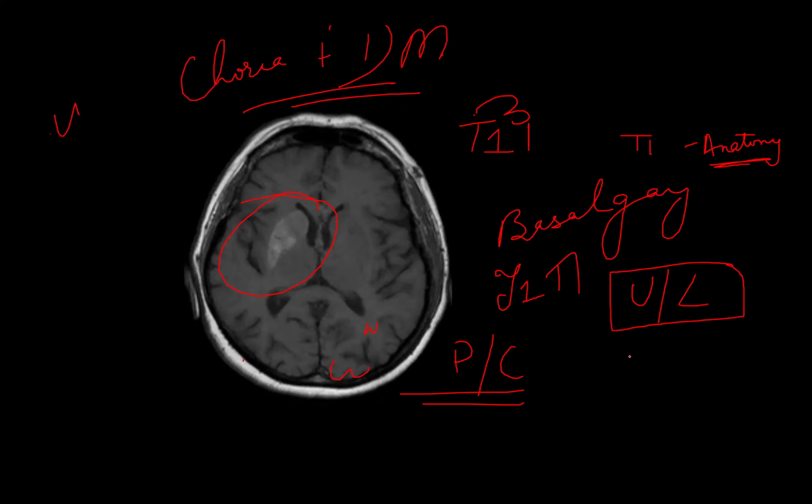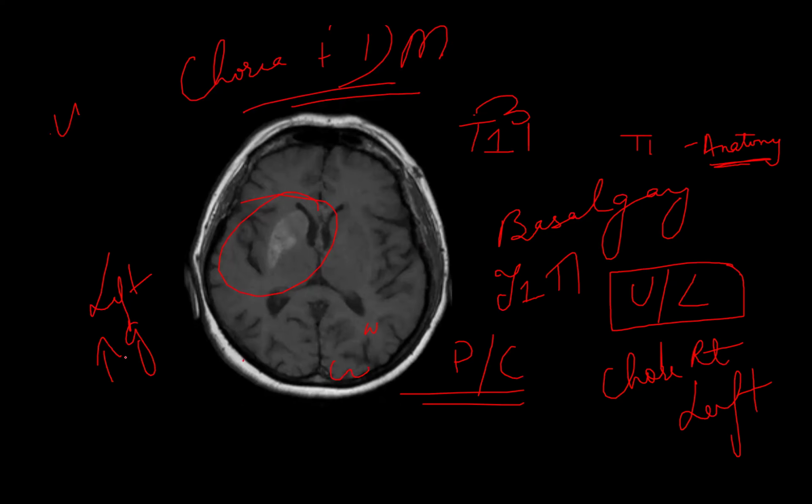And one more thing to remember, if the patient is having hemichorea on the right side, then the lesion will be on the left. Okay, so here since the lesion is on the right, patient presented with left hemichorea with increased blood glucose level. Yes, the answer is non-ketotic hyperglycemic hemichorea. So in this spotter, it is clinical plus radiological diagnosis. There are many DDs for increased T1 hyperintensity from subacute hemorrhage to Wilson's disease to carbon monoxide poisoning, many more things. So this was the spotter number one.